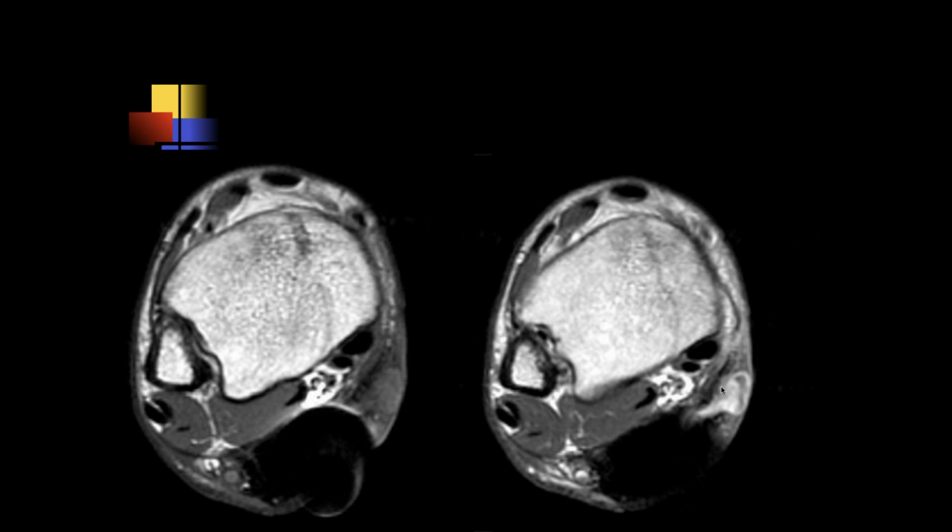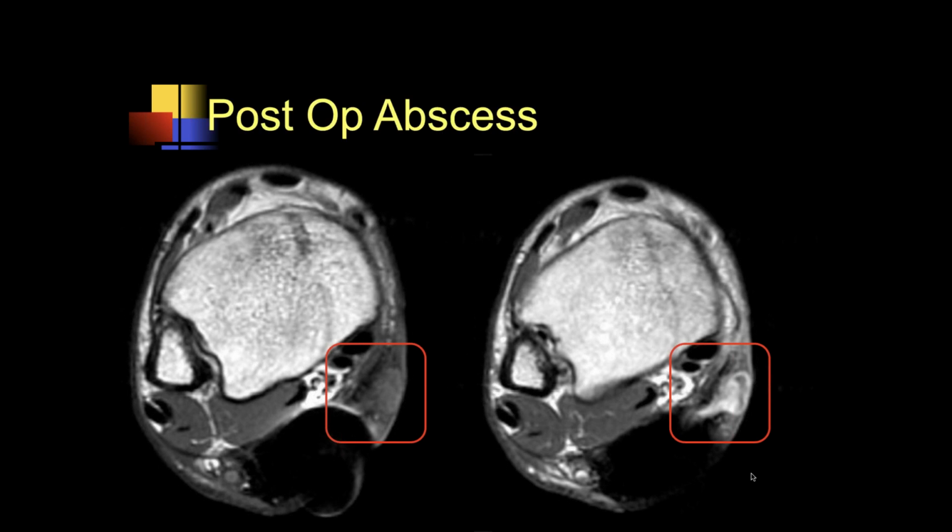Is there some hardware there? Some hardware posteriorly near the Achilles. Yeah. And then there's an abscess spanning near that with a small track. Yeah, this person also had surgery for Achilles repair and got infected after surgery.